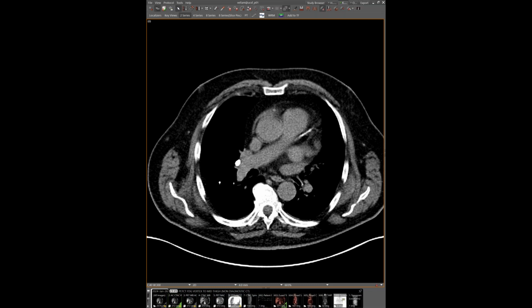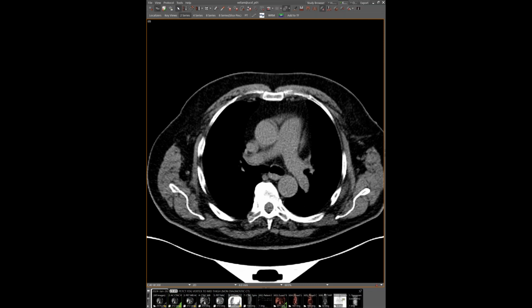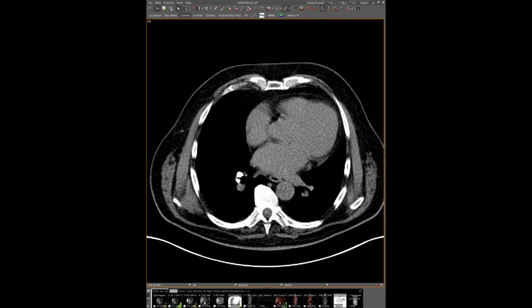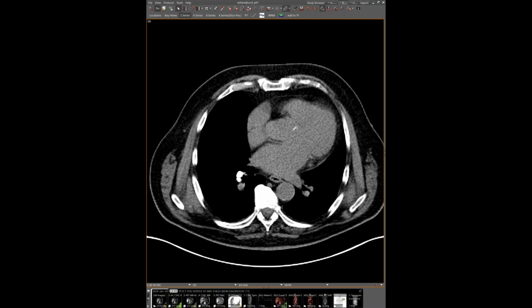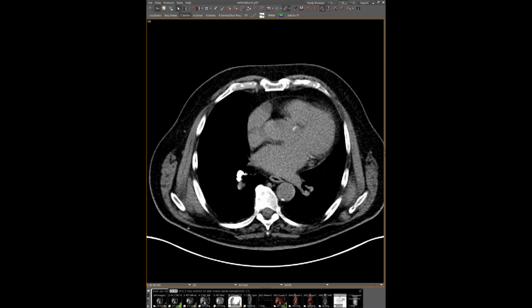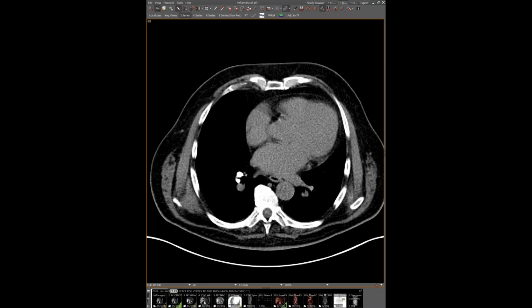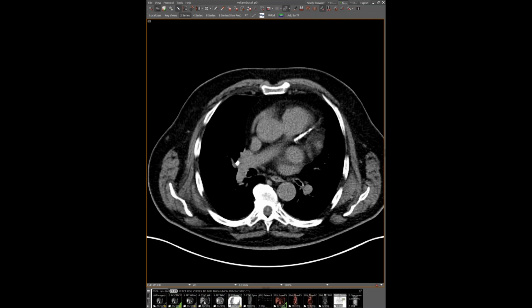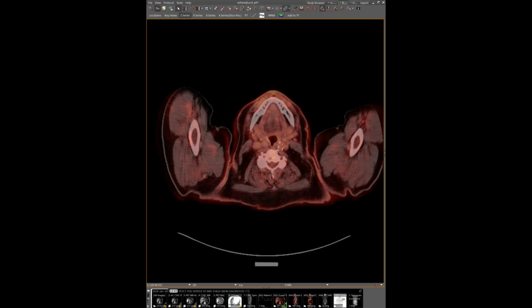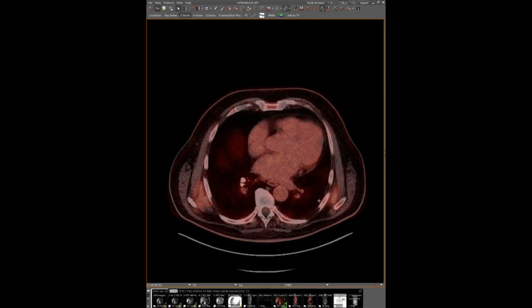So I'm going to start off with a very classic imaging finding that we see a lot, because I think it pairs nicely with the case that I'm about to show, which is this patient here. I actually don't even know what their history was, but they were getting a PET CT and they have this area of soft tissue underlying the tip of the scapula, underneath the normal musculature of the chest wall, between that rib and that scapula. They have it on both sides. So a really classic look for an elastofibroma dorsi on both sides here. And as we know, on PET, they can be a little bit hypermetabolic, just like we can see here. So classic appearance.